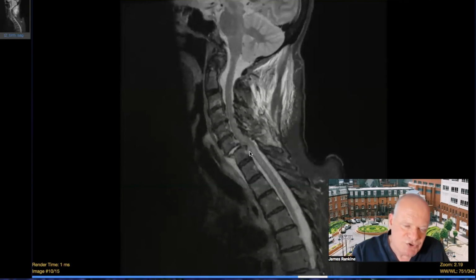Longitudinal fracture lines, which often run from one facet joint to the other, are evidence of hyperextension injuries, which can cause cord injury at the time that the injury occurs, but they're less unstable than the flexion injuries. They're unstable in hyperextension, but there's less of the risk of the head and cervical spine falling off anteriorly.